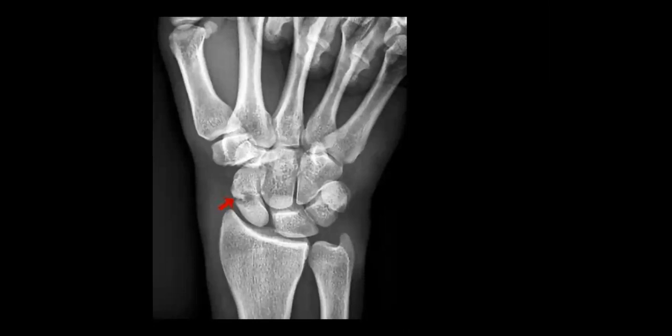A clinical point to also note is that sometimes scaphoid fractures can't actually be seen on imaging until 5 to 10 days after the injury. So it's really important that these patients are followed up afterwards, because at this point, resorption of the bone has occurred around the fracture site, therefore making it more obvious.